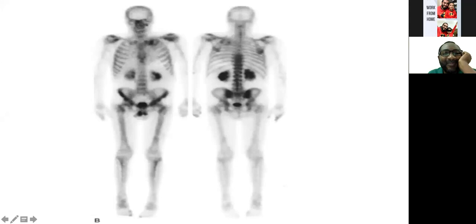There are no definite lesions detected at the appendicular skeleton, and the skull also shows no definite uptake. In summary, there is focal uptake of the primary tumor in the lung and possible suspected bone lesions in the ribs in the posterior aspect, left side. We need further static views of this area to confirm the presence of metastatic lesion.